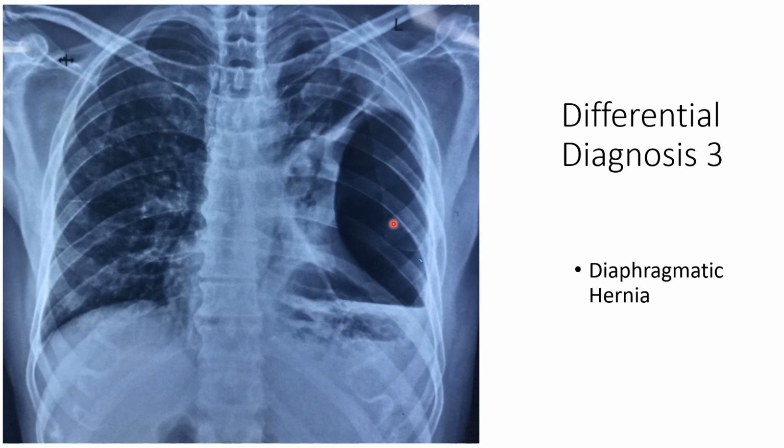So it is important that when you have doubt, don't rely on X-rays. If you take an X-ray and you find that something is not quite okay, then always go for a CT scan before you do any procedures. So in this case, it's a diaphragmatic hernia.